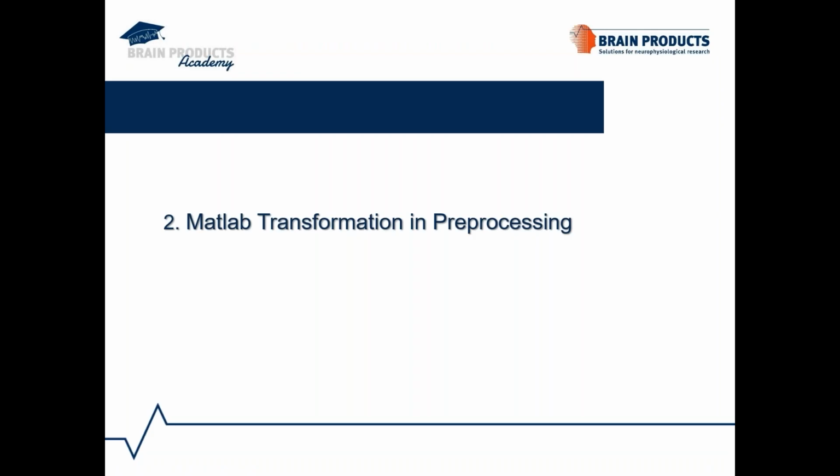Okay, hopefully now you are familiar with the interface and well informed about the options available in the transformation. How about I start showing you what we can do with the transformation in the pre-processing stage.